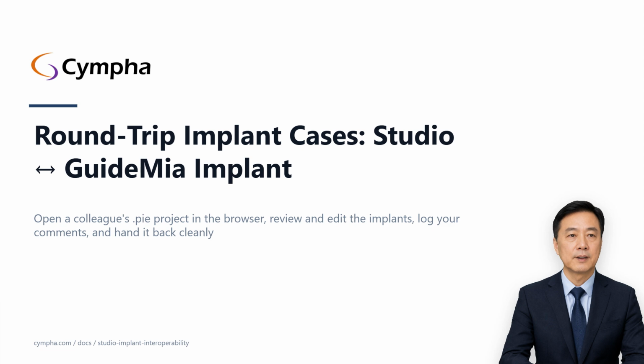Budget about 15 minutes for the first case, most of that is verifying you have the right DICOM, and 5 to 10 minutes per case after that. Follow along on screen, or listen now and read the written guide later.